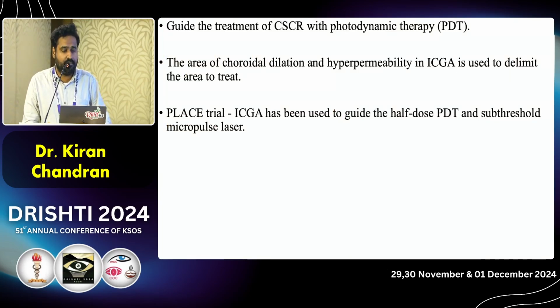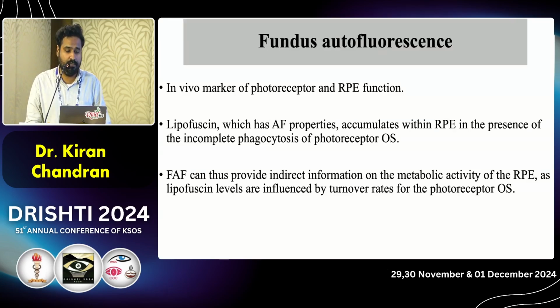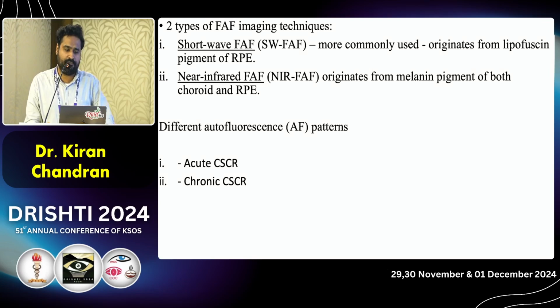ICG also helps in guiding treatment using photodynamic therapy, and the PLACE trial, which was done recently, is an important guide for this. Fundus autofluorescence is an important marker of both photoreceptor and RPE function. Lipofuscin, which has autofluorescence property, accumulates within areas of dysfunctional RPE due to incomplete phagocytosis of these photoreceptors. The two types of FAF imaging techniques are short wavelength and near infrared.